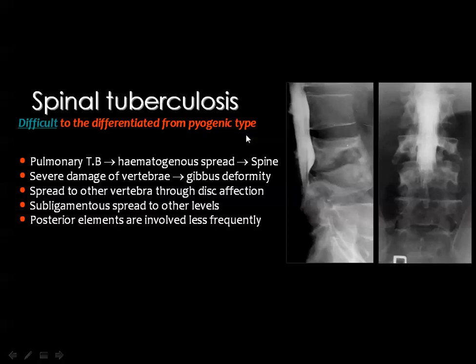In the early days before MRI, we used to differentiate both by the presence of abscesses in the paravertebral area, and we thought that if there are big abscesses in the paravertebral area, especially if they involve the psoas muscle and the back muscles, we call this of tuberculous etiology most likely. But nowadays you can see huge abscesses of non-specific organisms like Staphylococcus aureus, for example.